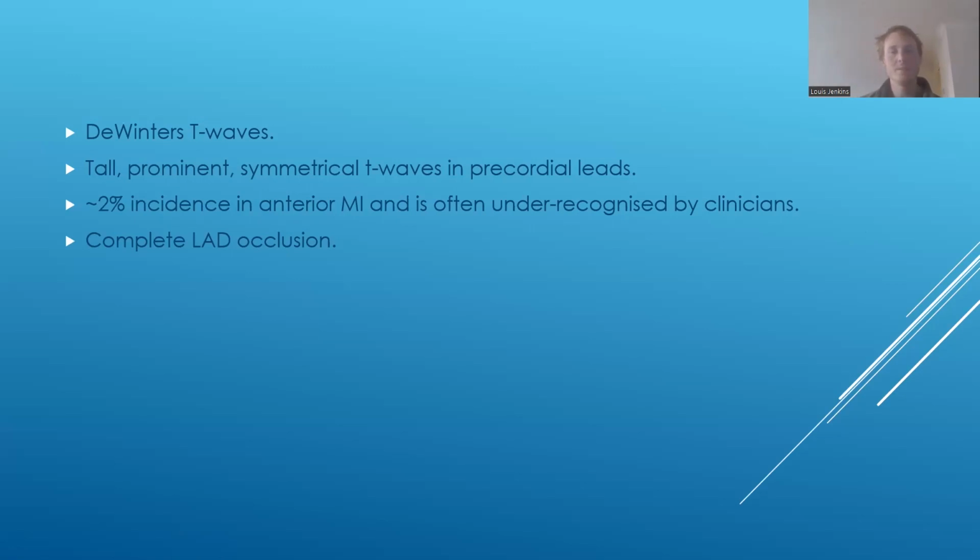So basically, the reason behind why these T waves occur, we alluded to it a little bit before, but the ECG changes depending on how long the patient has been infarcting for. And in that really hyperacute phase of infarction, the really early presenters, the first thing that changes is the T waves just become tall. The ST segment generally stays about the same, but the T waves become massive. They become peaked. We usually refer to it as HATW or hyperacute T waves.